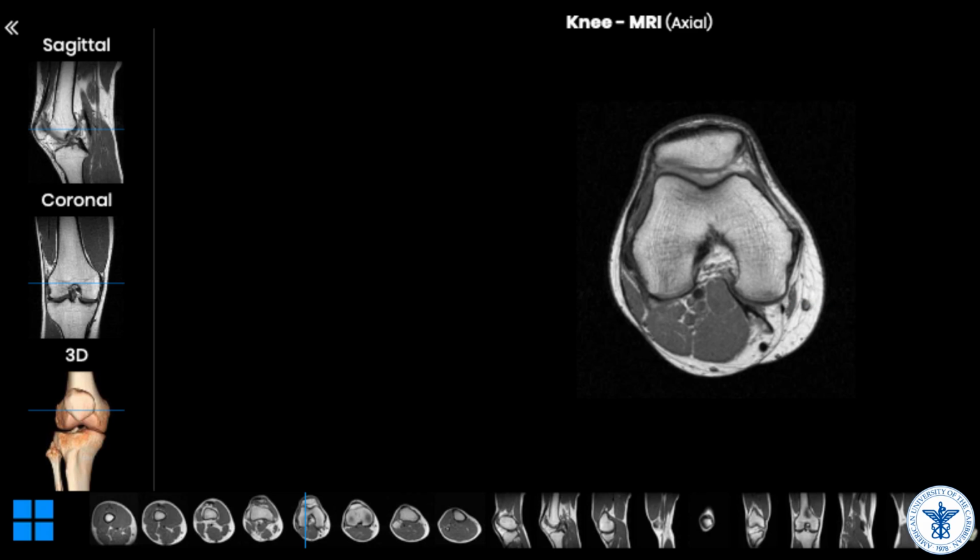Well, let's look at the other ligaments which we see here. This dark spot in the middle of the intercondylar fossa, it represents the anterior cruciate ligament, and on both sides of the knee joint you also see some darkenings, right? These dark areas show us where the tibial collateral and the fibular collateral ligaments are located. The other ligaments in front here are the medial and lateral patellar retinacula.